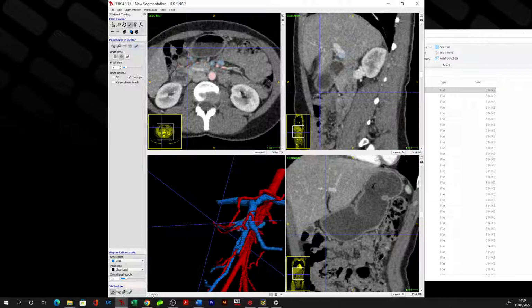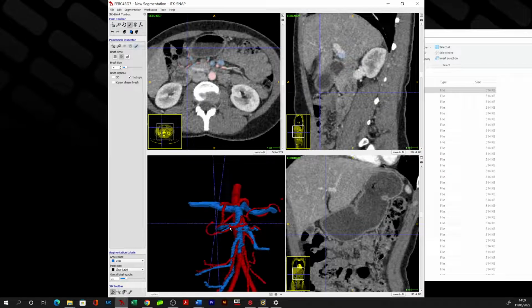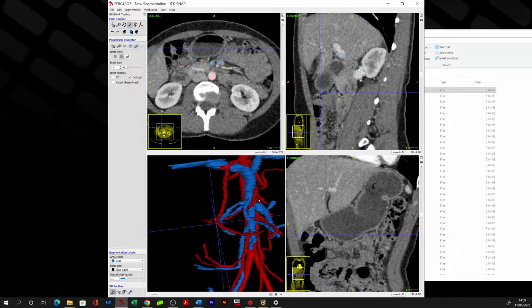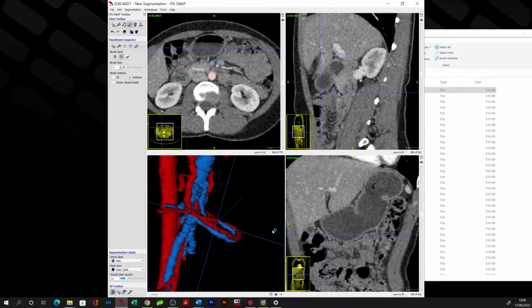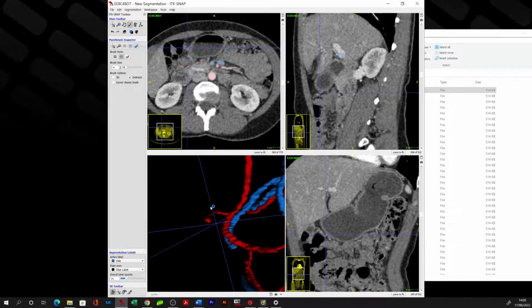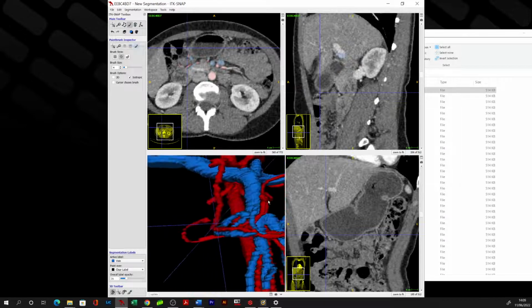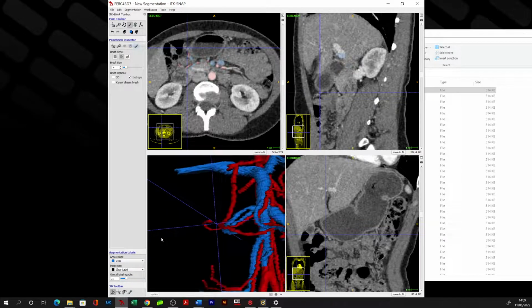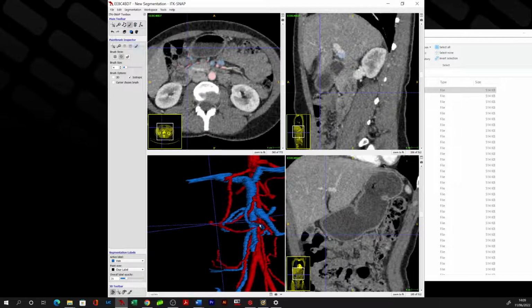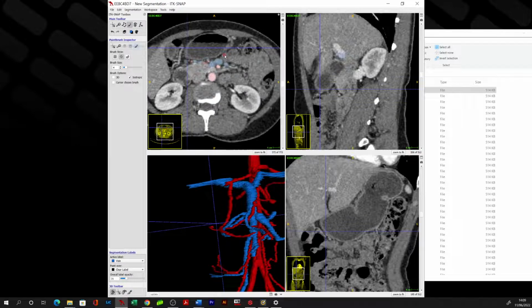So we can update this now, and this is looking pretty good, I would say. This is probably Henle's, and then you've got this middle colic vessel, which is coming off anatomically in approximately the right place. What I would say is, if you've got this lone MCA branch here which doesn't have anything accompanying it, be cautious in that situation.